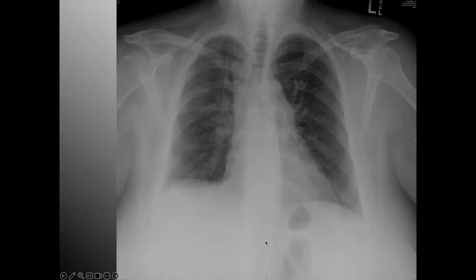You've got B, bones. I don't see any obvious breaks, fractures, fissures, dislocations. The spine looks like it's aligned. C, cardiac. I can see my right anterior border, my left, but you can really tell on the left-hand side it traces all the way to the diaphragm. Here I've got sort of a rounding that's happening, a blunting, and notice the volume on this right side is much less than the volume on the left.